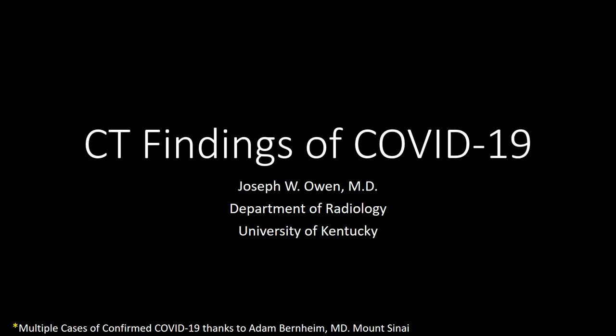In this screencast, we will cover the CT findings of COVID-19, the disease associated with the new coronavirus. I want to give special thanks to Adam Bernheim for providing multiple cases of confirmed COVID-19 pneumonia.